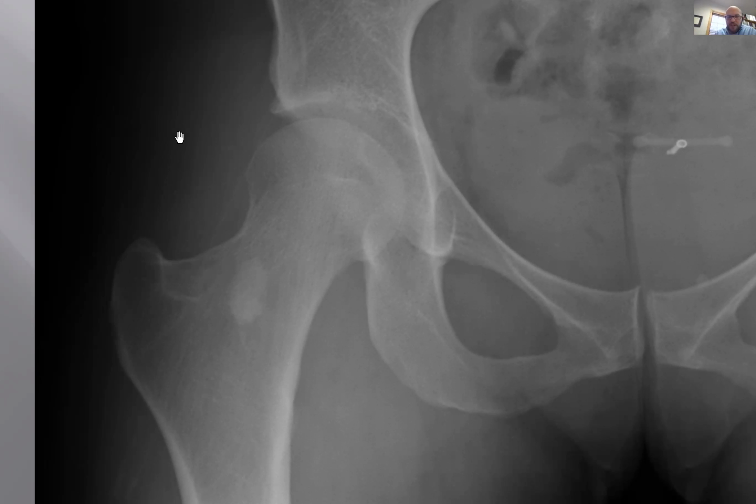It's solitary. It's non-aggressive. Any other descriptors? How would you describe this? Now, what are some descriptors you would say? Radiopaque. Yeah, radiopaque. Good. What else? Confined. Yeah. So a confined, oval, radiopaque, kind of homogeneous. It's really evenly opaque.